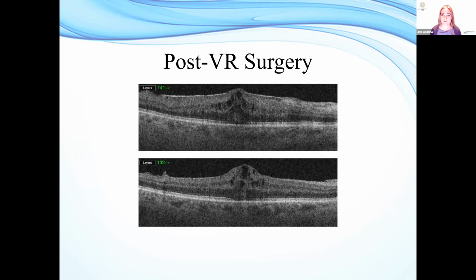Now, here's my post-VR surgery slide. At the end of the section, I'll pause quickly and see if there are any questions. This is my patient from about a month ago. The top picture is his epiretinal membrane. There's the bright line on top with some cysts.